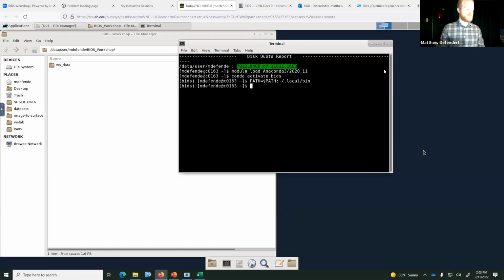The only downside to it though is, like I said, there's a lot of metadata that's stored in the DICOM files that's lost whenever you convert to Nifties. So if you're converting non-BIDS Nifties to BIDS Nifties, you're not going to have access to all of that metadata. And in fact, I think that might be one of the reasons why HeuDiConv would fail here, because it's trying to look inside the headers for the DICOM files, but those DICOM files don't exist.